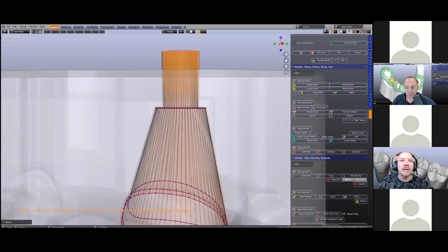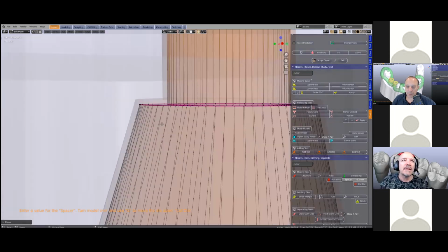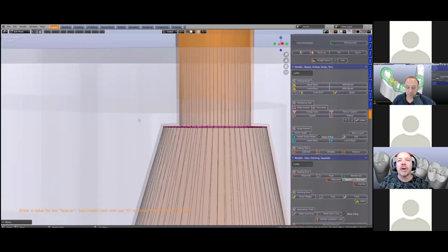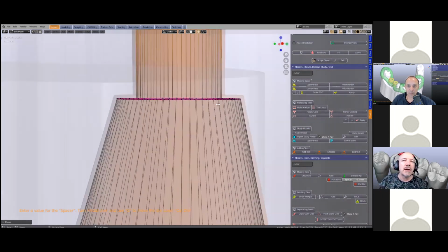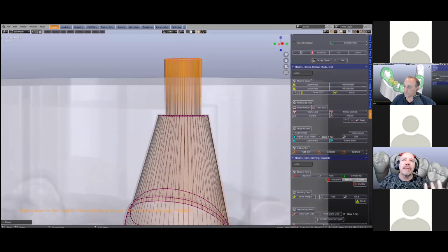If you want to do a die, we've had some users say, but we don't want a space between the two. But with the resins that we are working with, it's not 100% exact, and we're looking at expansion. We've demonstrated how to put this both at 0 with no space, but to me it makes no sense, because if it expands sideways, it would also expand in the Z direction, which means your die may not even go down 100%. So I think the space, this clearance, could be useful, but this is something you guys have to figure out.